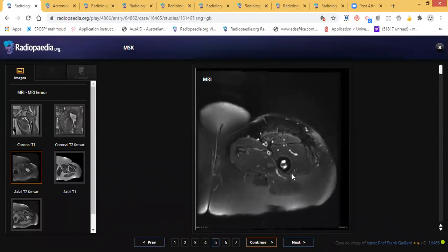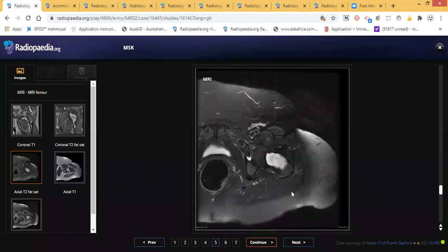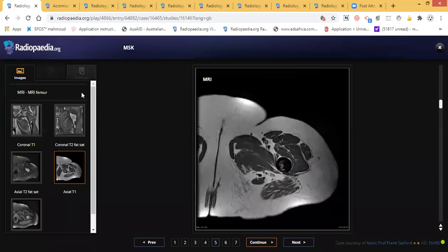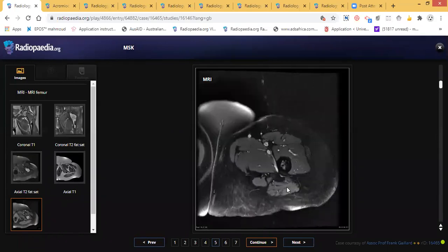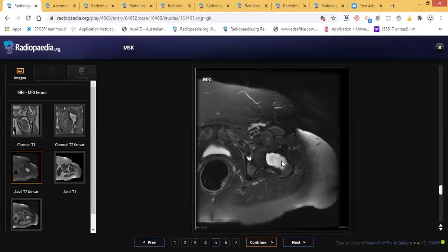It is a very good expression they mention in the MCQ books that in a long bone, one of the good differentials will be fibrous dysplasia. Again, this appearance, this is the most contrast. Maybe, but why is it lipid? I can show you that the fat suppression here is high. So I think it is not lipomatous, because if it is lipid, it will be suppressed. It will be black in the lipid type, right? You agree with me?